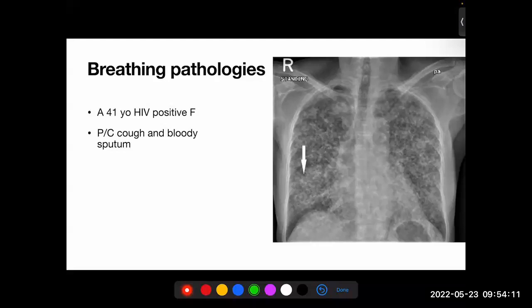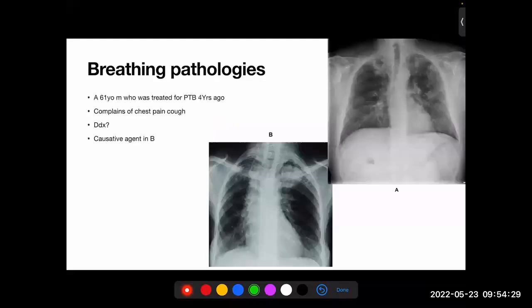So I think here people know, so we jump. But it gives this millet-like appearance. And then don't jump. Please teach yourself. Always remember ABCDE. Okay. Please. So moving on. The people who are jumping now, you can jump.